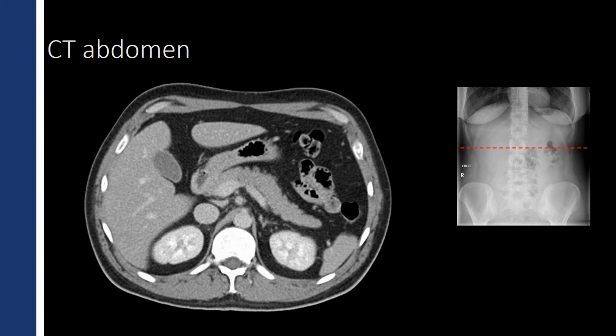Okay, now we're a little lower in the abdomen. How do I know that? Well, for one thing, I don't see lungs anymore. So we're out of the lungs. We see some more of the organs that are down a little bit lower in the abdomen, but we still see the liver over in the right abdomen. The liver will be with us throughout most of the abdomen.